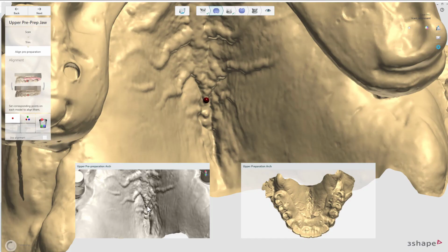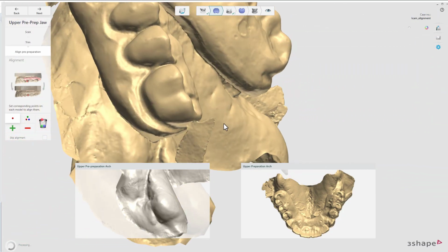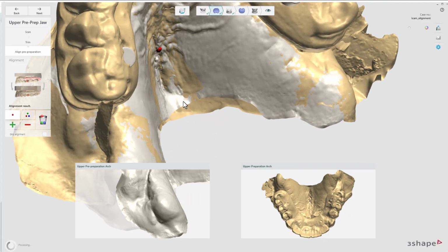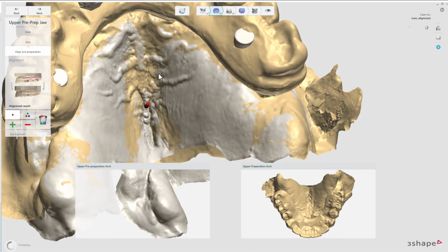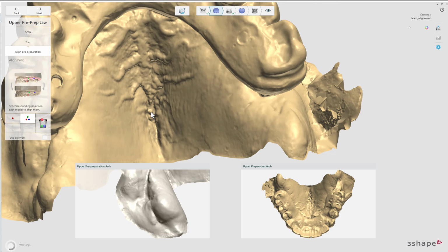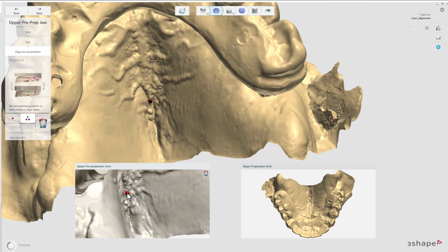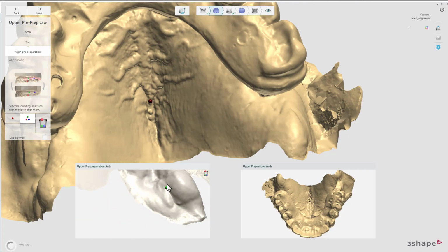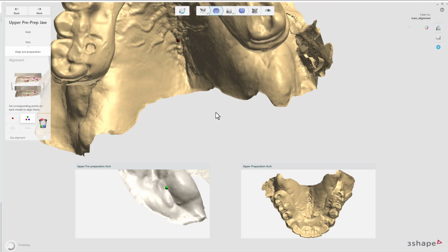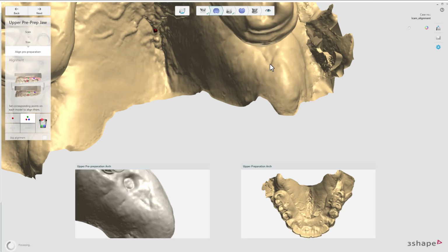Alignment tools, we're going to do 1, 2, come right here, 3. This is going to be right here, 2, and then you can see right off the bat that's pretty good. But if we're going to nitpick and want to do 3-point alignment, we'll just do 3-point alignment, see if it becomes a little bit better. Sometimes it does, sometimes it doesn't. Some people say, oh, you must always do 3-point alignment because... No, you don't need to. If the data is good, the data is good. It aligns.